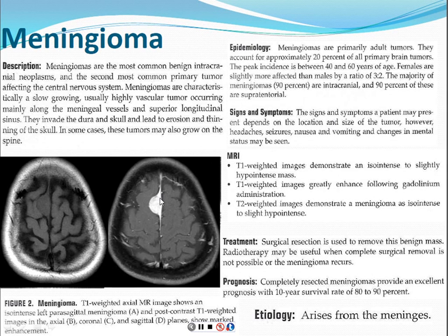But these are MRI images, and this is showing a really, really brightly enhancing, light bulb bright lesion, kind of like one of those liver lesions I showed you earlier, the hemangioma on T2 imaging. Of course, this is with contrast, so it's a little different, but they call it very light bulb bright. And this little thin tail that it has going off in each direction is called the dural tail, where the tumor just spreads out and thins out along the dura as it trails off. So that can really help you make the diagnosis.